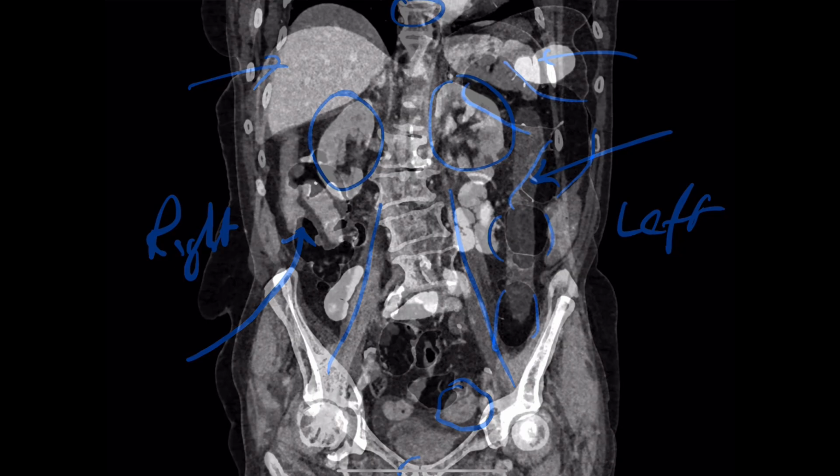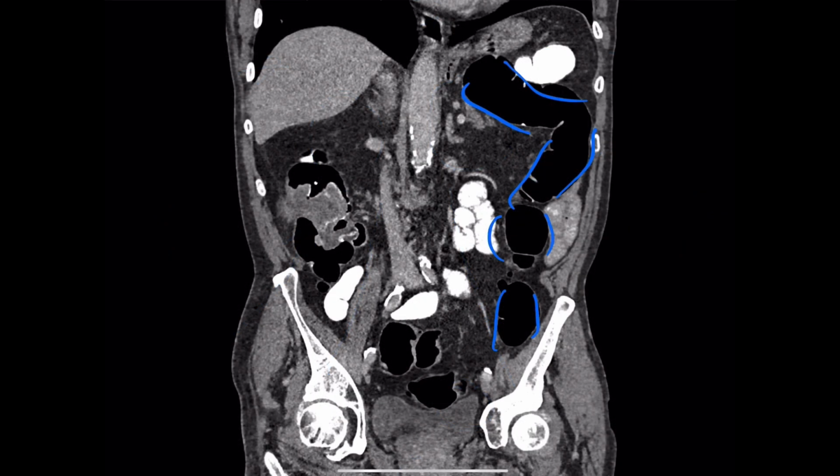I don't think so. The color is black. So does that mean black on a CT might indicate something? Yeah, black on a CT scan depends what windows you use. You start getting technical, but in a CT scan, you often window for different settings. So if we're looking at soft tissue, we window for an abdominal setting. If we're looking at the lung, we window for a lung setting. And if we're looking at bone, we would window for a different setting.